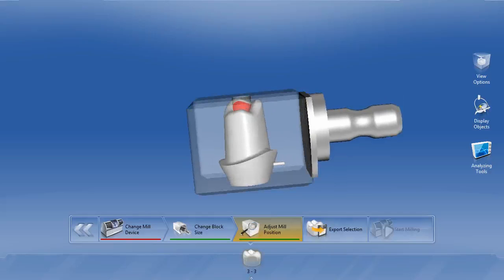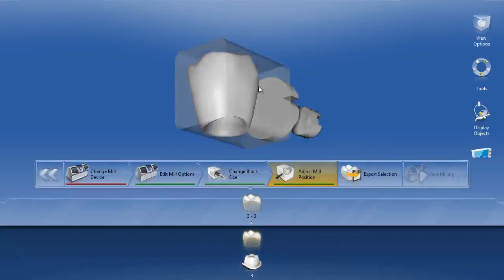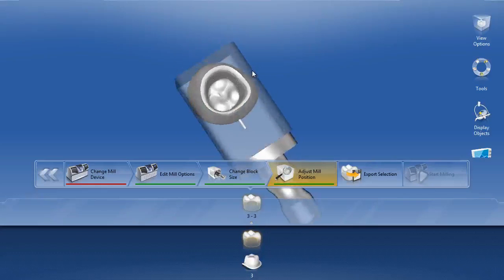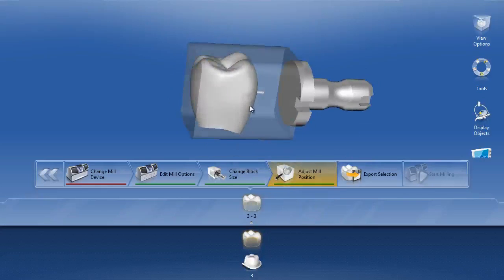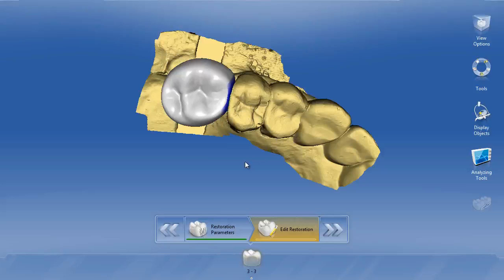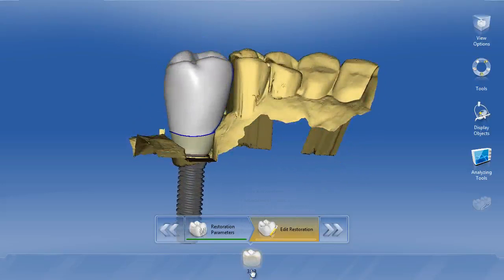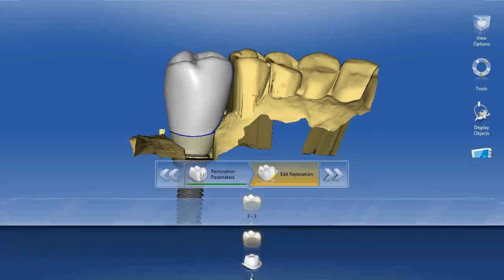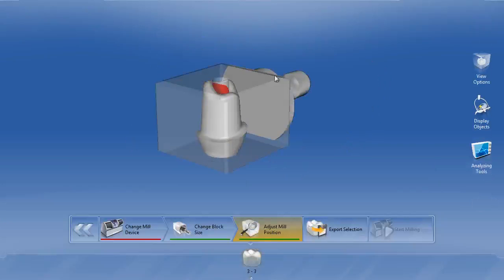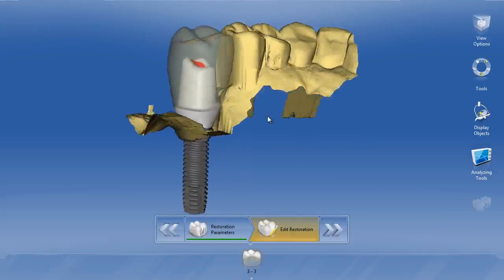Now if we switch down to the actual crown, we look at that, that looks good as well. So no problems, everything is looking good. So let's go ahead and look at the design. We'll back up to the design phase. This is the crown. You can see the split line here. Let's go down and look at the actual split abutment. Bring that back to the design phase. And again, it looks very, very good.